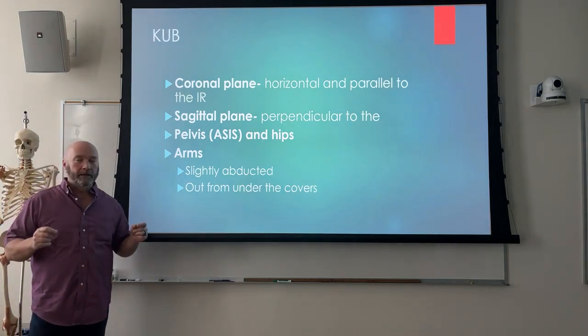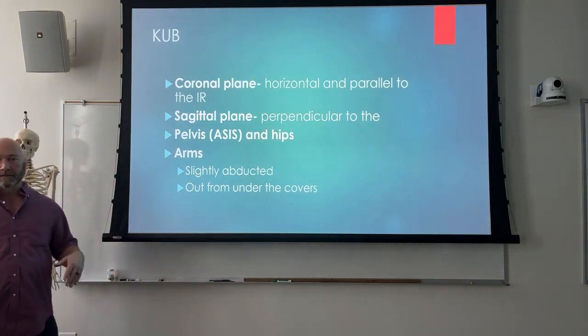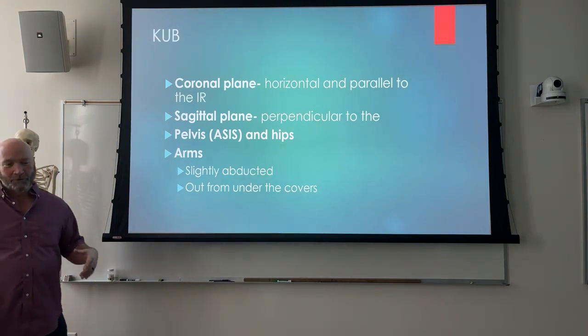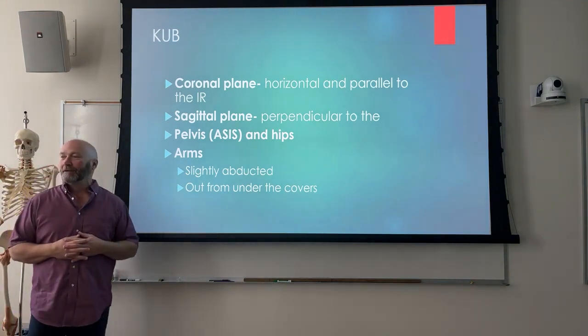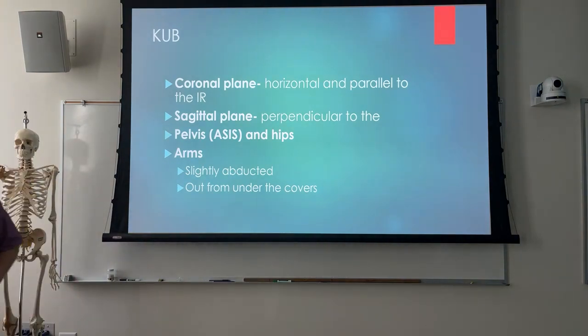So really, really recommend that you get the arms out from underneath the covers so that you can see them, so that as soon as you rotor up, you can look and watch while you make your exposure.